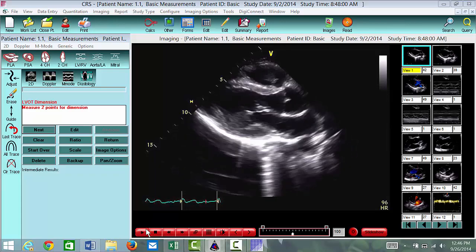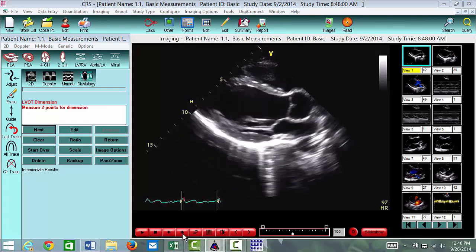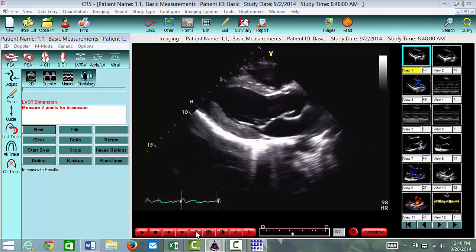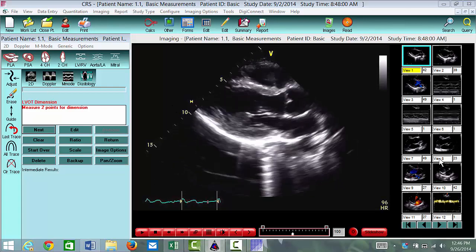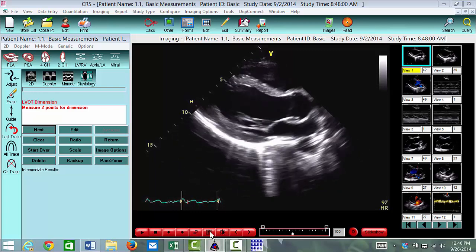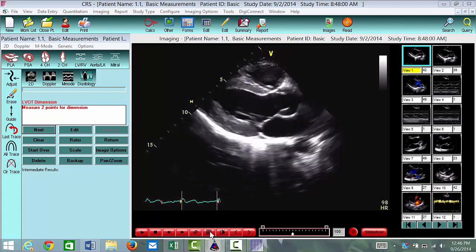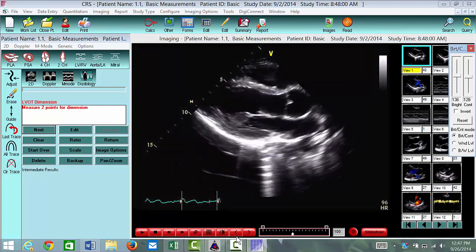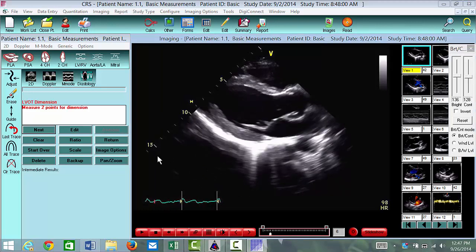On this image right here, you have these icons on the bottom. This is play, stop. These are forwards and backwards of the thumbnails. So if I wanted to go to the next thumbnail, I would hit next. This is if you wanted to have this screen be the full screen of the image and not all this extra stuff. This is preview, which we don't have previews built in here on purpose just because it makes it a little bit more difficult for people to manipulate the software. If you wanted to increase or decrease the brightness, you could do that using this button right here. And then to go to the next frame, you can click the frame button here.